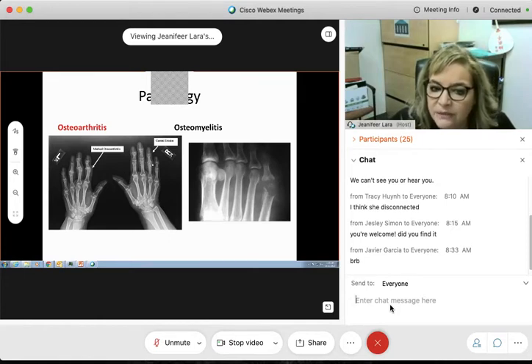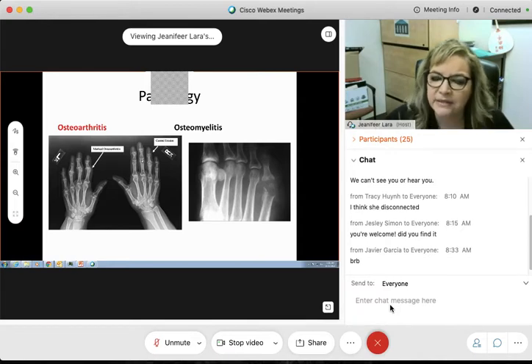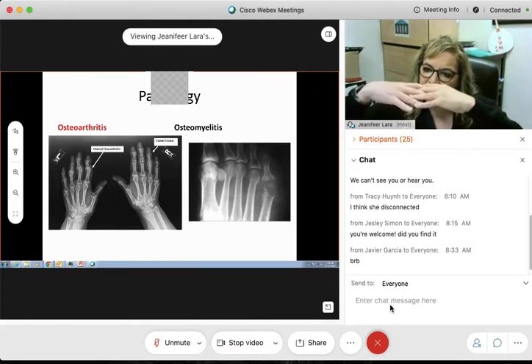You see this right here, very different from this one. This one has more of that erosion, that degenerative action of the joint. Here we start to see the loss of these sharp outlines, and start to see them kind of mesh together.